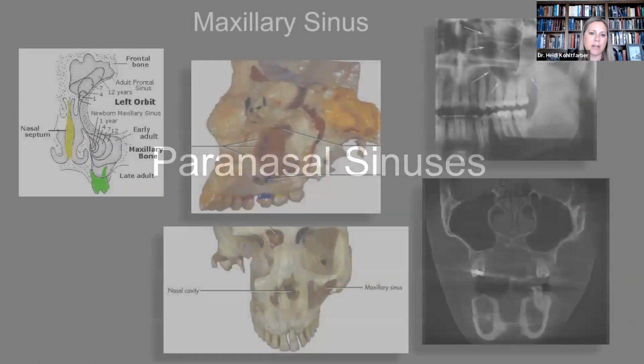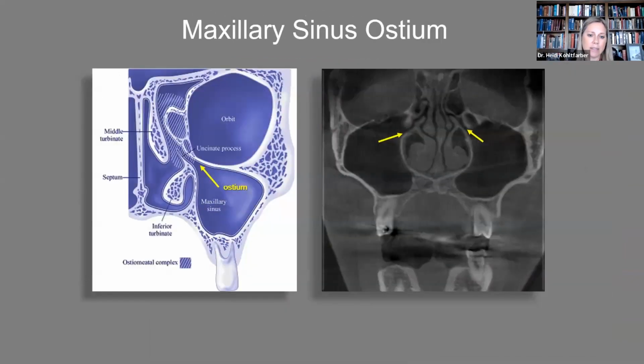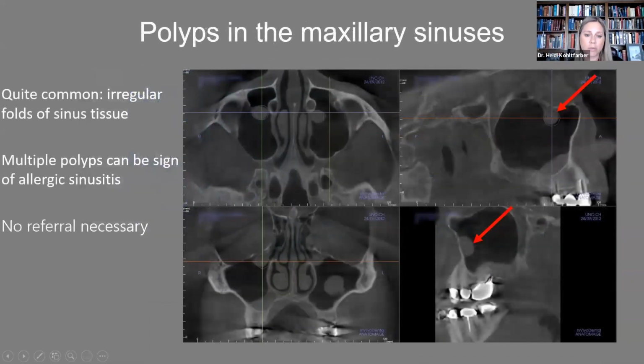All right, paranasal sinuses, I'm going to go through really, really quickly because we don't have much time and I have fun cases I want to show you. The majority of us will see things within the sinuses. Of course, we're worried about the sinus drainage pathway. We did do a whole lecture recently on paranasal sinuses, so I would definitely encourage you to go and spend some time with that if you are interested.